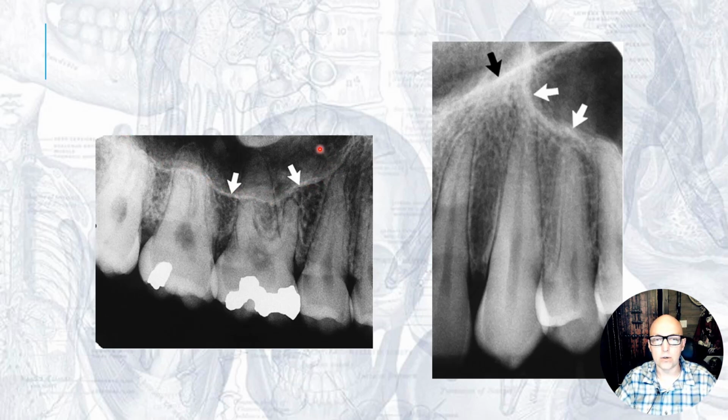So what we're showing right now is anatomical structures, and this is the maxillary sinus. A lot of times it will dip down in between the roots of maxillary molars. So you see that. It can even dip down in between and go way down between the molars. It's just a lot of variation, and that sinus continues to grow. It continues to pneumatize over time.